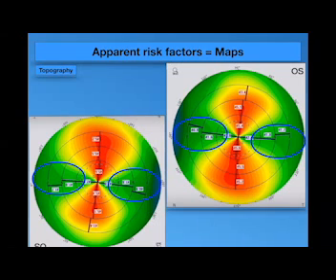So we have to measure now the difference between the superior point and the inferior point in the central 6 millimeter of the cornea. You will find here that the superior point is 45.1, and at the same circle, the inferior point is 45.5. The difference is just 0.4, which is more in the inferior than the superior.